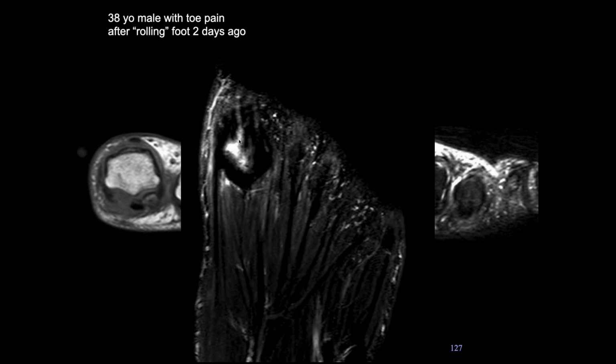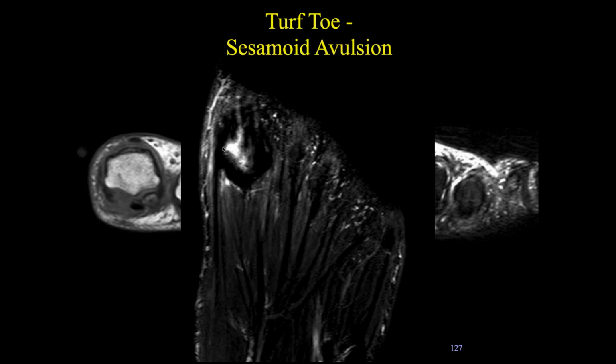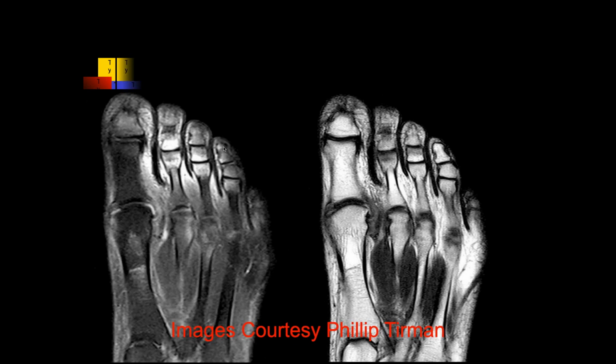Here we can see again fluid and increased signal intensity. The sesamoid, yeah. And that's the medial one, right? Medial, right. That's the most commonly injured one. And the lateral doesn't get injured very often. Is that your findings, John? Yes.